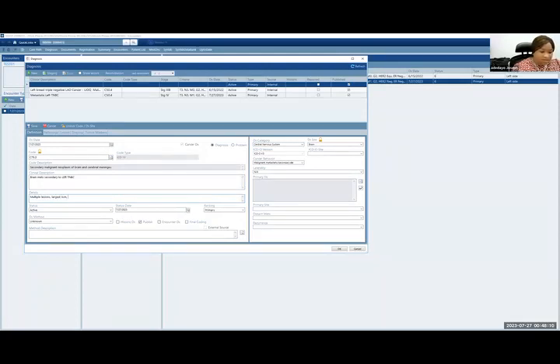And I can say maybe both hemispheres, or just whatever detail I want to add. This status is active. As of today, she has brain mets. Diagnostic method is on imaging. So like I said, it was PET-CT for the other one. But here, let's say we want to say it's an MRI. So I can say it was brain MRI. Is how we diagnosed it.